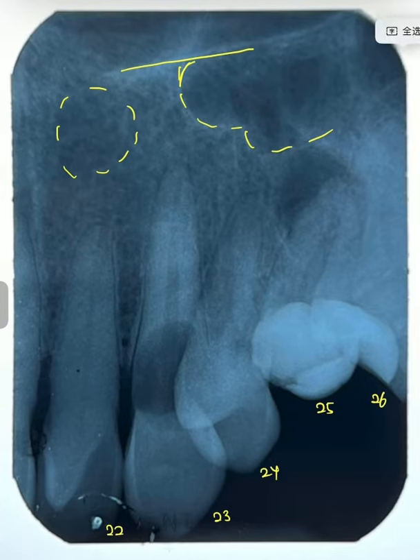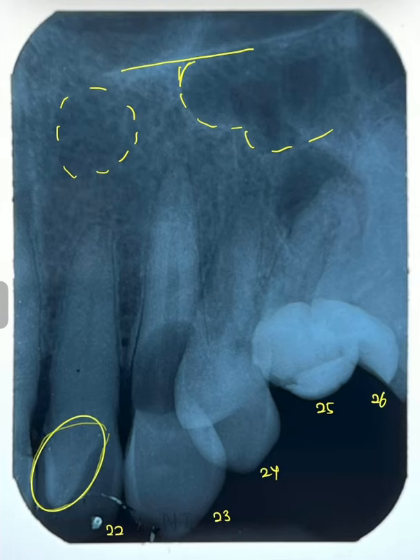and the maxillary sinus. For 2.2, there is a well-defined radio-opaque V-shaped projection at the center of the crown, suggestive of Talon cusp. At the alveolar crest, a horizontal bone loss up to 4 mm below CEJ can be noticed both mesially and distally. Hence, the radiographic diagnosis for 2.2 will be Talon cusp and horizontal bone loss.